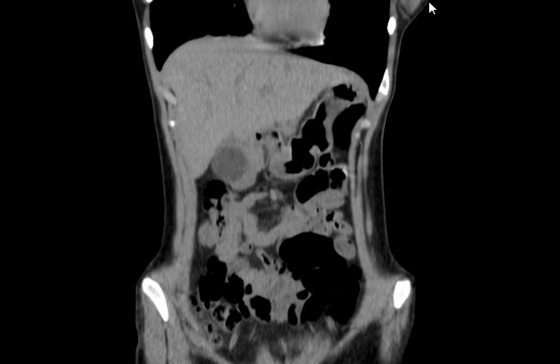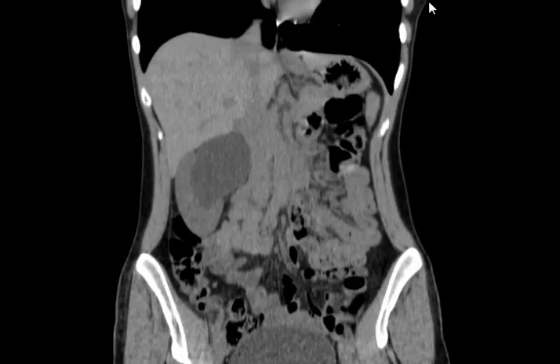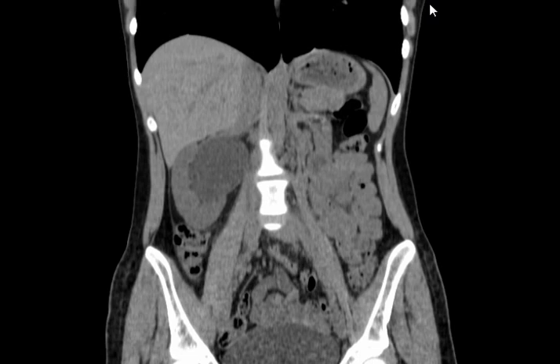and this is a real genuine hydronephrosis, what would you say was the cause? Maybe a congenital anomaly. Like what? What causes hydronephrosis congenitally? Maybe a UPJ obstruction, a pelvic ureteric junction obstruction, right? So maybe.